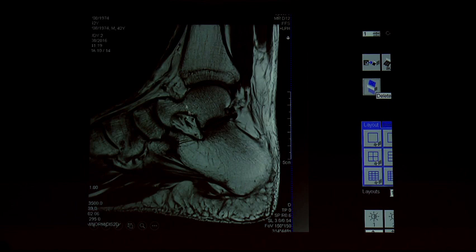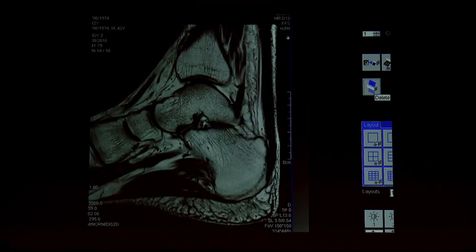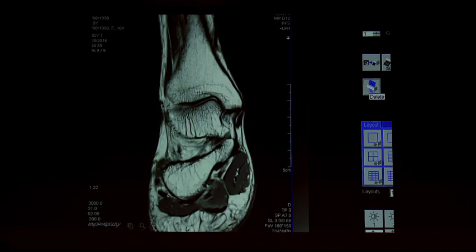Whenever there is a fracture of the talus or calcaneum, it will go for narrowing of the sinus tarsi. So it will go for sinus tarsi syndrome, where the patient will have midfoot pain, and this is the thing we have to look into. This is the sinus tarsi, this is the interosseous ligament, and these are the cervical ligaments. It will be filled with fat.